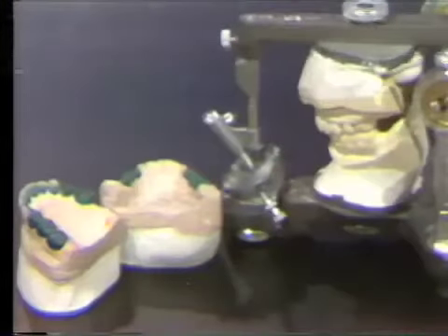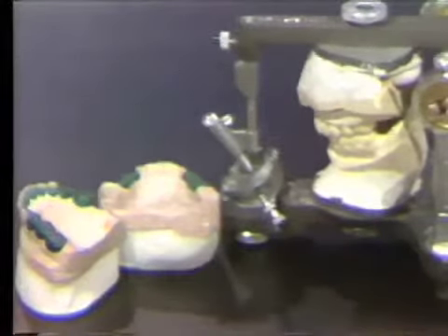Now it's also well that when the case gets to the laboratory that we go ahead and give the laboratory technician a call on the telephone and communicate directly with him. We must remember that we've got lots of hours of time, lots of money involved in this case. Now to aid the laboratory technician in aesthetics, we can send the original casts along to the laboratory, casts that we had of the original case. If the anterior teeth are not too mutilated, we can use these to determine the anterior aesthetics.